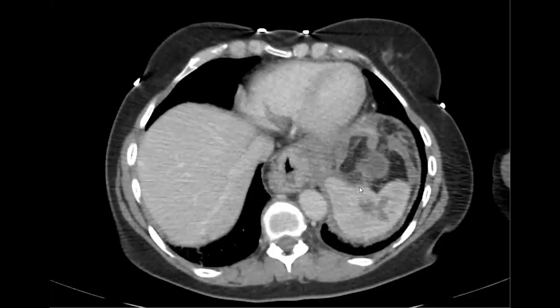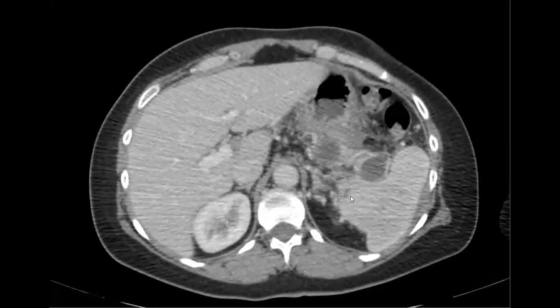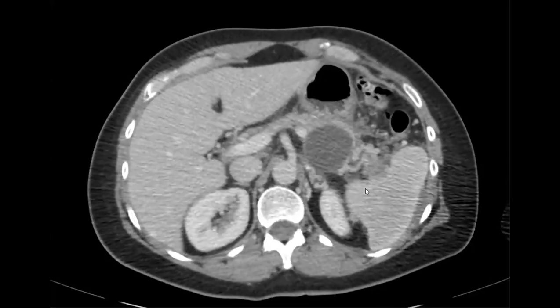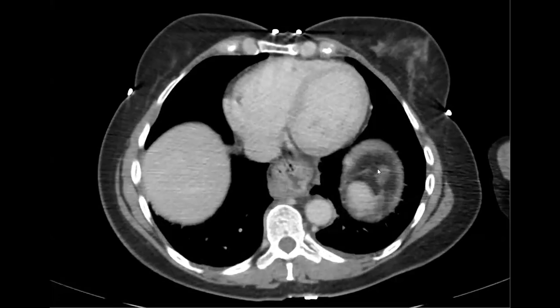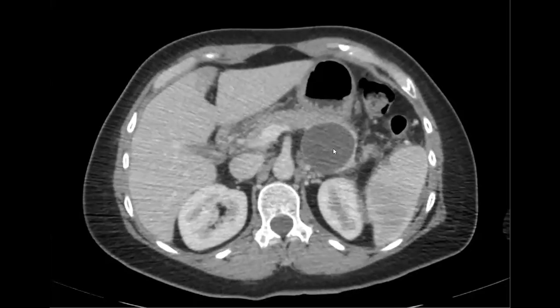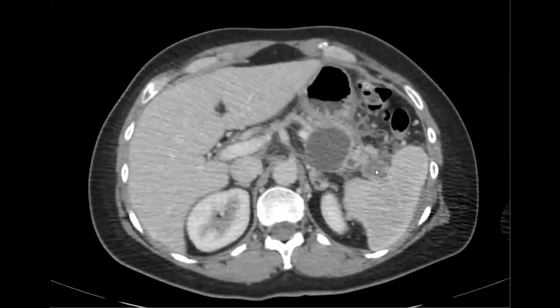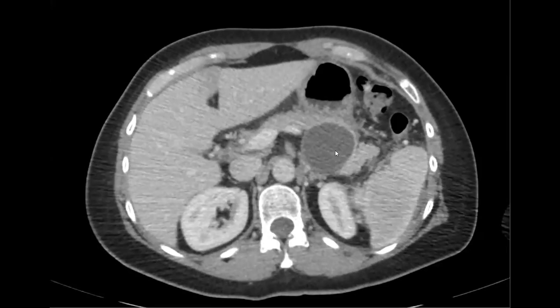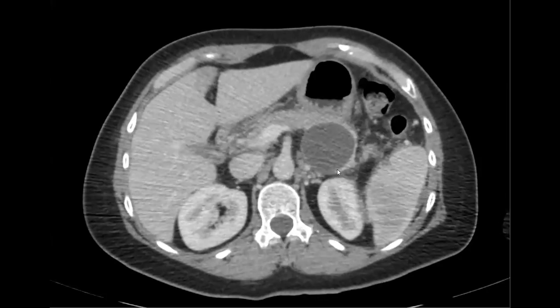We thought this was all from pancreatitis, and we got a kind of weird history. There was a history of pancreatitis, but we didn't have any prior imaging. I do think the pancreatic tail is a little dilated, and all of this seems reasonable for sequela of pancreatitis. The question is, is this just a pseudocyst related to all of this in this person with this reported history of pancreatitis? I can see how you could think it's a pseudocyst, but it looks very, very round and well circumscribed. It's at the body-tail junction.